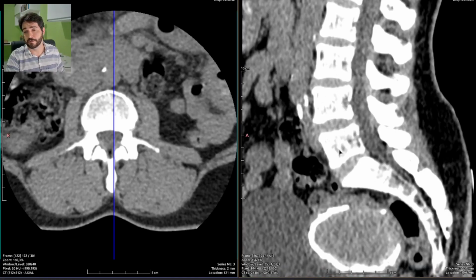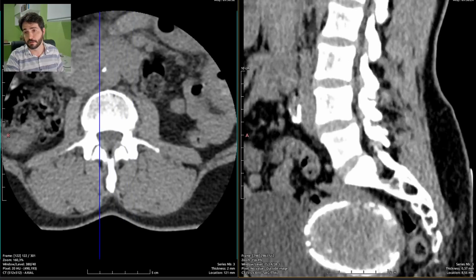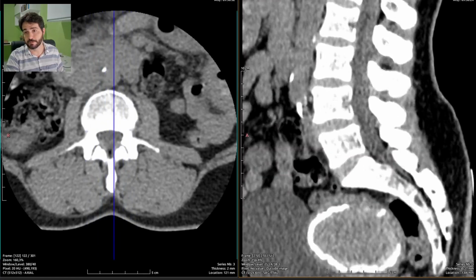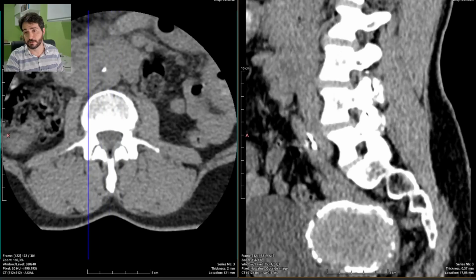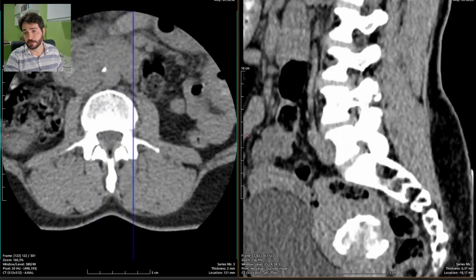These are the vertebral bodies and these are the vertebral discs, the ones that herniate. So this is a disc extrusion that goes all the way from side to side, but especially on the left. The same feature is right here on the next segment, and this is it.